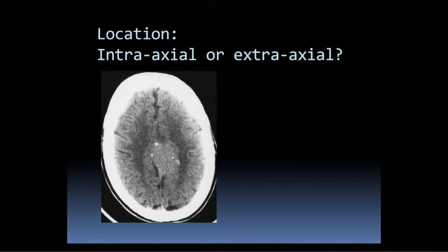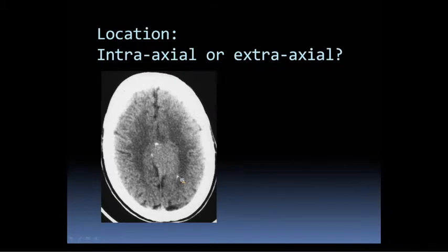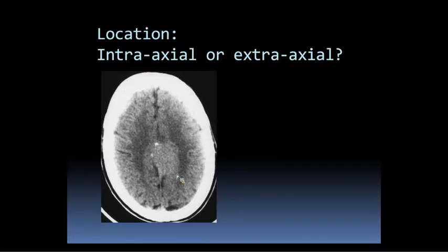It's very uncommon, actually. Typically what we do is we find the gray-white junction, and if it's buckled away from the lesion, then it tells us that it's an extra-axial lesion, a lesion coming from outside the brain. It's very uncommon to have something inseparable from the cortex really arising from the cortex and expanding it without involving the white matter. So, as a very easy thing, if you can identify the gray-white matter junction, and if it's buckled away from the mass, then that tells us it's probably an extra-axial lesion.